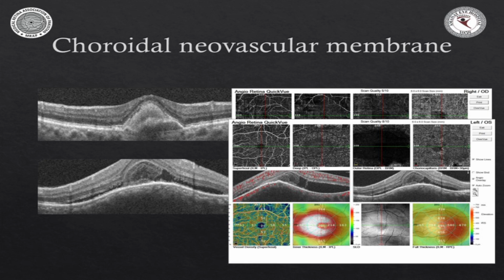If it's not going away, it's staying stagnant, that is an indication for you to extend your treatment. As for sub-RPE fluid, we have no clinical guideline yet in CNV. This looks like sub-RPE fluid, but actually isn't. This is a lesion that we call prechoroidal cleft. Prechoroidal clefts are formed when you've treated a person repeatedly with anti-VEGF, and when anti-VEGF causes shrinkage, the CNV lesion shrinks from its size and gives way to this optically empty space.